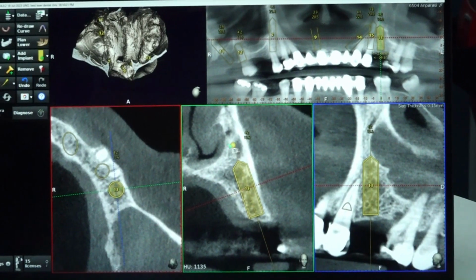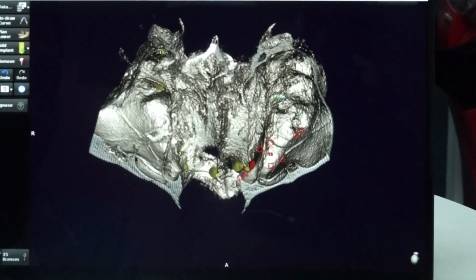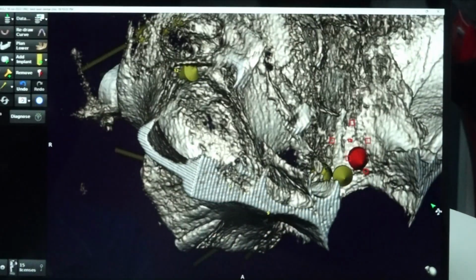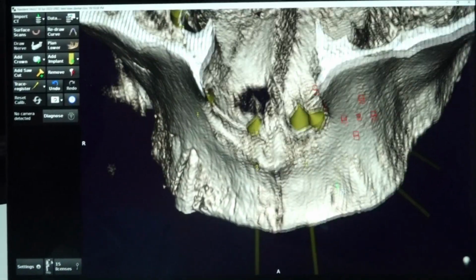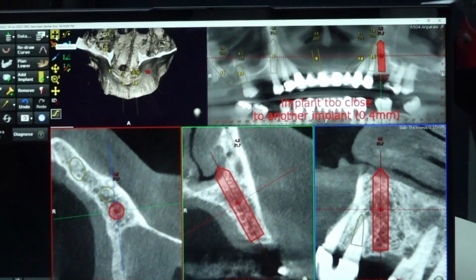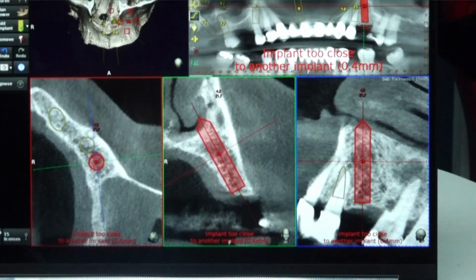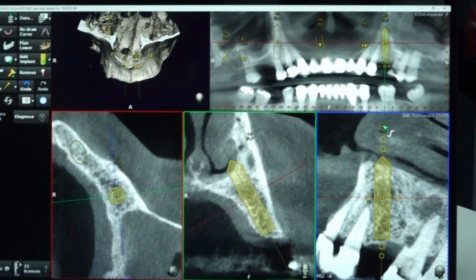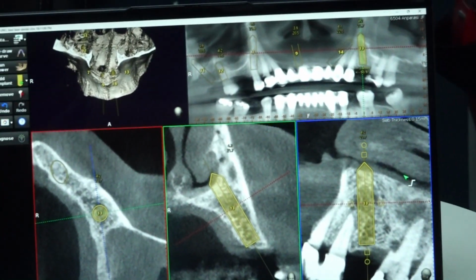Of course it will show close, but for the sake of understanding, can you see there all the 3 implants are close to each other, which is not favorable. So don't try always to place more number of implants. Even if the implant number is very less, make sure they are surrounded with good bone, good engagement, good stability, getting good nasal floor engagement. Okay. So what we will do is, only 4 implants in the premolar to premolar area.